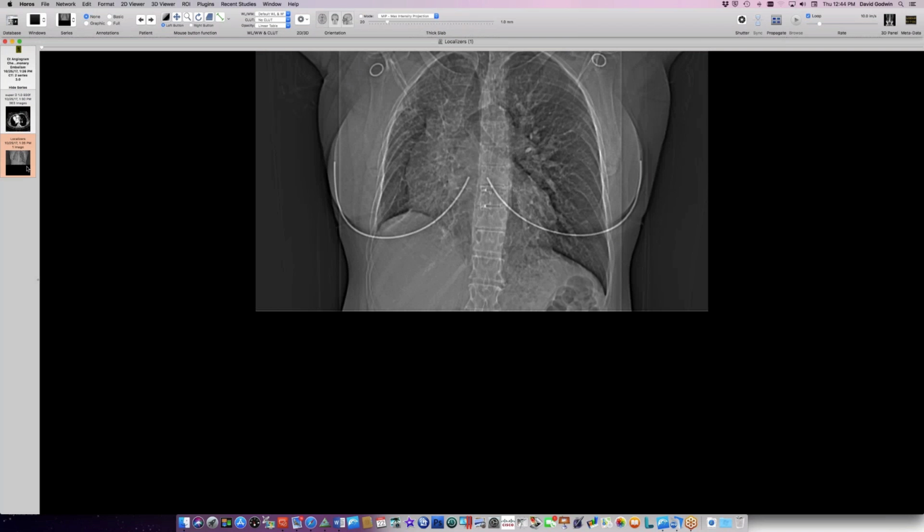But they can. We had one young woman here. I think I showed her case years ago. She was 18, started smoking with her friend out New Year's Eve, came in really sick, had consolidation, small pleural effusion, looked almost like an edema picture, but didn't fit right. She was in the ICU, and eventually when she got a bronch, they got the eosinophils, gave her steroids, and she's back on the floor within half a day. Because he responded rather quickly, I was wondering if this was acute eosinophilic pneumonia or just eosinophilic lung disease.